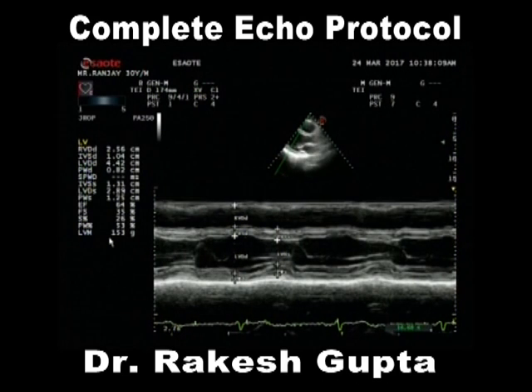At the level of level 2 or level 3, now we are able to say which patient has a concentric LVH and which patient has an eccentric LVH. And this is what is done today, on the basis of this LV mass by M mode.